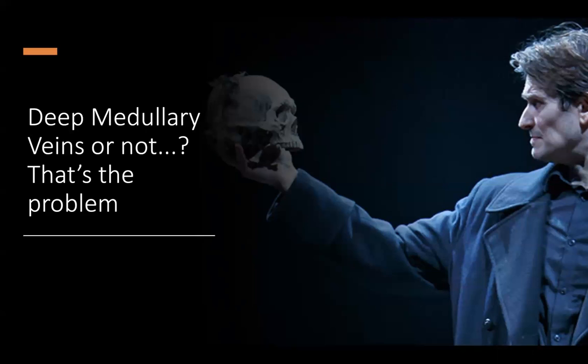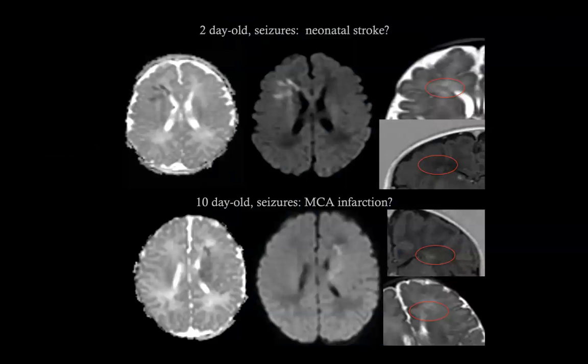Then, reading the literature, I figured out that there is this relationship with deep medullary veins that sometimes has been stressed when it comes to punctate white matter lesion. So deep medullary veins or not, quoting Shakespeare, that's the problem. So let's start to dig into the literature. First, I want to show you these two cases that came to Great Ormond Street from an external hospital.